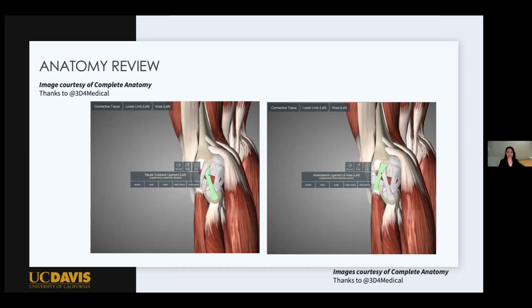I encourage you to review Kentaro Onishi's wonderful AMSSM lecture on posterolateral knee ultrasound, which describes the structure being more aptly named the anterolateral complex, and describes how to scan this region, including anchoring the distal end of the transducer between Gerdy's tubercle and the fibular head, and orienting the proximal end of the transducer slightly posteriorly. The RSNA, or Radiological Society of North America, has excellent content listed online if you are interested.